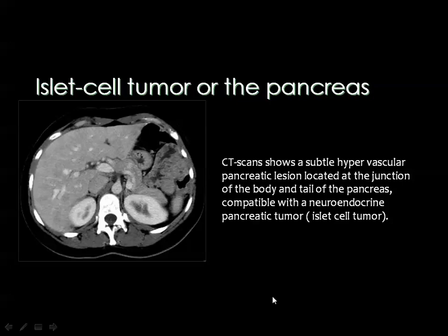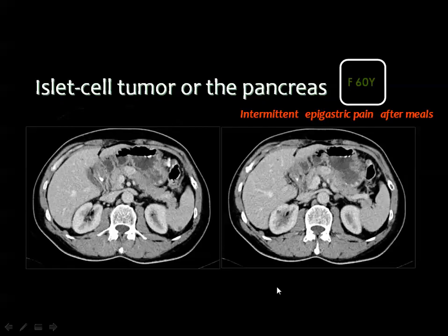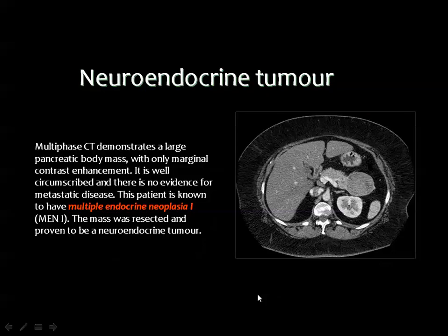Based on the laboratory and the clinical findings, the clinician is sure that the patient has an insulinoma. Then they open the abdomen and put the ultrasound probe directly on the pancreas, searching for the site of the tumor to be surgically removed. And here is a case of insulinoma of the pancreatic neck, showing a relative contrast enhancement in this contrast enhanced CT scan. Many times we perform CT scans or even MRI before and after contrast injection, and we usually cannot detect these very small tumors.